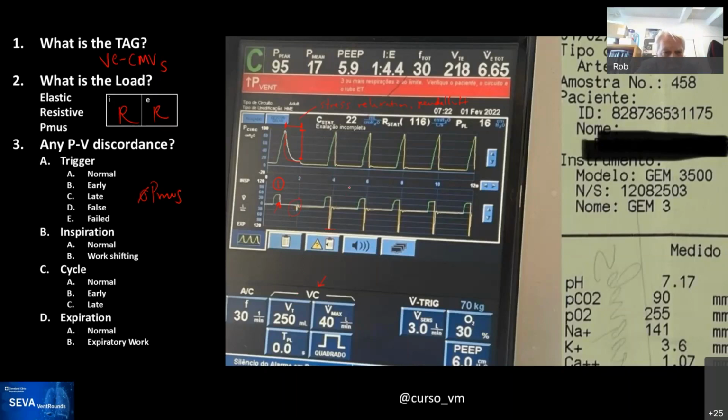So when the first one is small, what's contributing to it is just the plateau pressure minus the PEEP. So that's the driving pressure for expiratory flow. Whereas on the next breath, the driving pressure is the peak pressure minus the PEEP. So you're going to have a higher flow, but there's a very small volume that's being exhaled during that very short period of time.